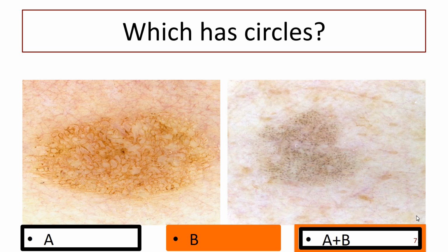No, it's not structureless. There are plenty of structures. Don't think about the background. Forget the background. Okay, black dots. Just for your information, these are grey.